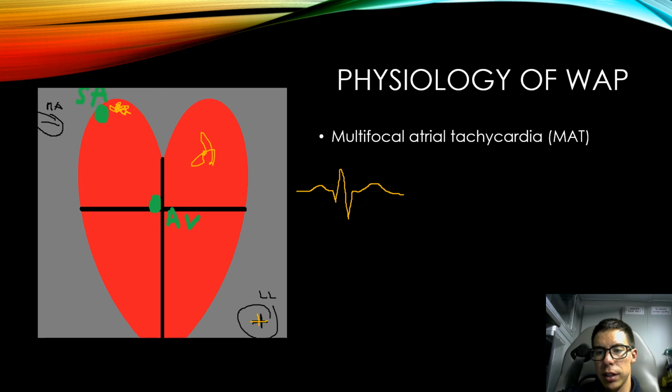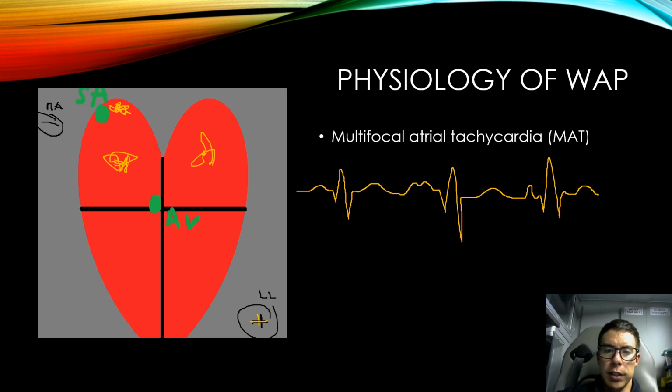You might see this. And say the third one is over here. You might see this. And then say the last one is here. You might see this.